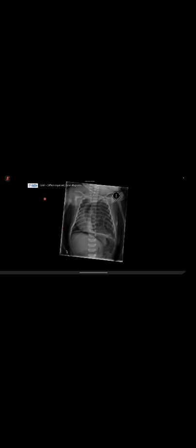Oh yeah, there, just above the clavicle. I think it's something that is superimposed, I think it's something external. It doesn't seem to be within the patient. Yeah, it looks like an external artifact. Okay, and then they said, could you please mark the pneumothorax in the second one on that case?